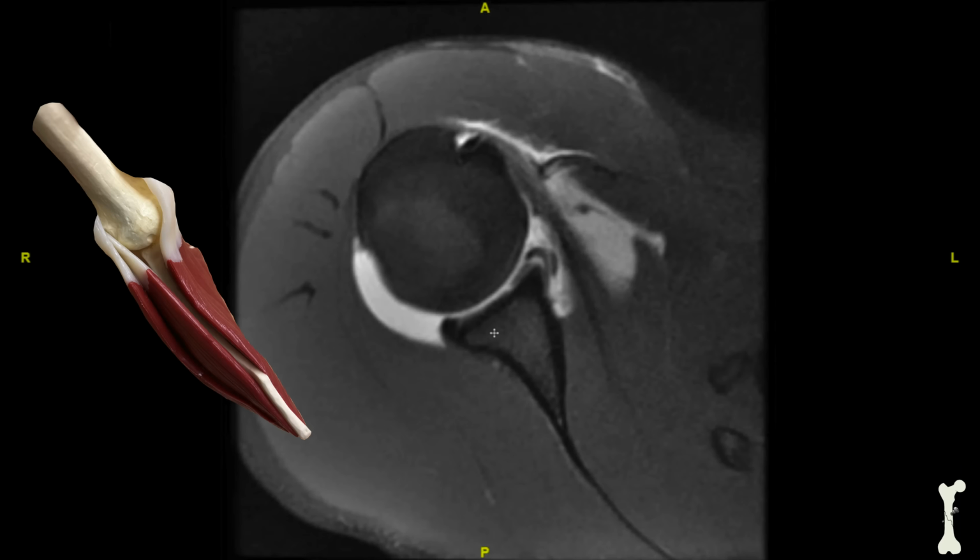And so this is the front of the shoulder, this is the back of the shoulder, and here's a muscle right on the front of the shoulder blade called the subscapularis. And we know it's sitting on the front because if we follow the glenoid, or the socket, and we follow this bony structure down, you can kind of see the cut of this particular MRI. You see a little bit of bone right here of the shoulder blade, and it's very thin. It actually is quite thin.